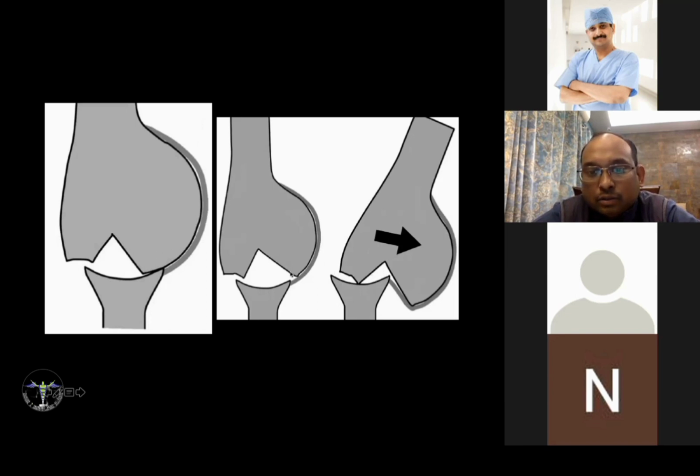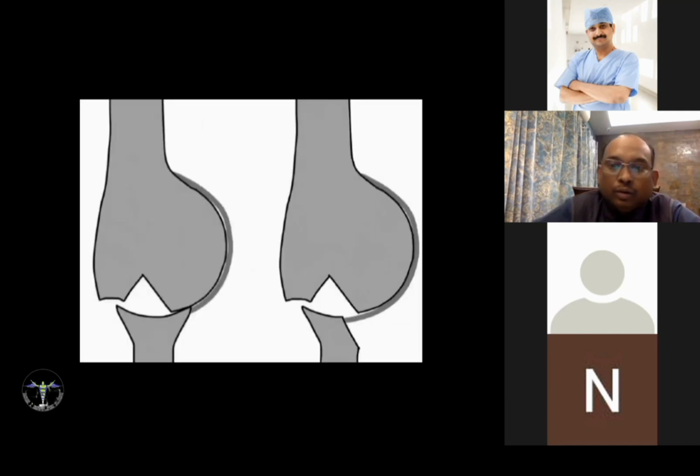That means there is a defect of the humeral head which is larger than the glenoid, and once the movement goes to extreme range, there will be dislocation, and this defect gets engaged with the glenoid. So this is called the engaging type or the off-track lesion. Whereas in this case, there is no bony defect in the glenoid. The glenoid is normal shaped. The Hill-Sachs lesion is there.